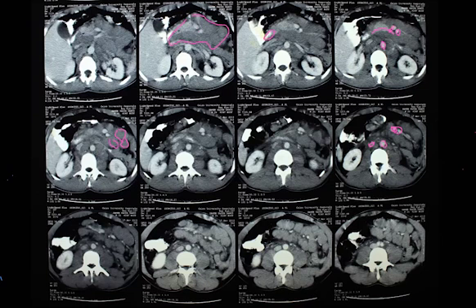Obviously, if they're hypodense focal lesions in the spleen, it would almost clinch the diagnosis, although you still need a biopsy because you won't start giving them chemotherapy unless you know the type of lymphoma. Okay, where is the spleen here? There is no spleen here.